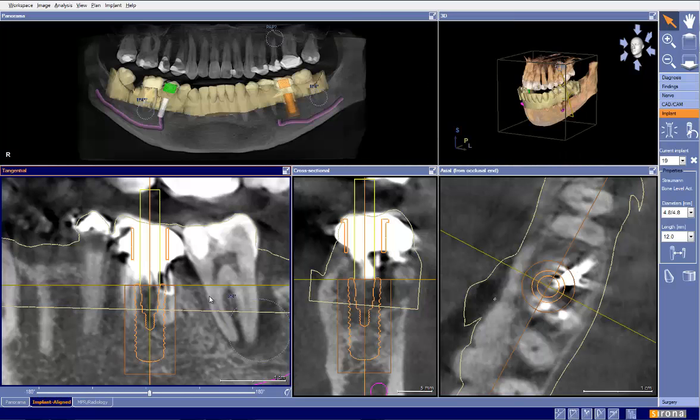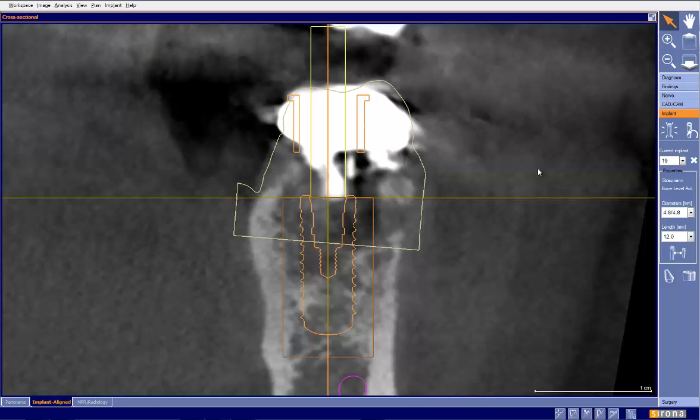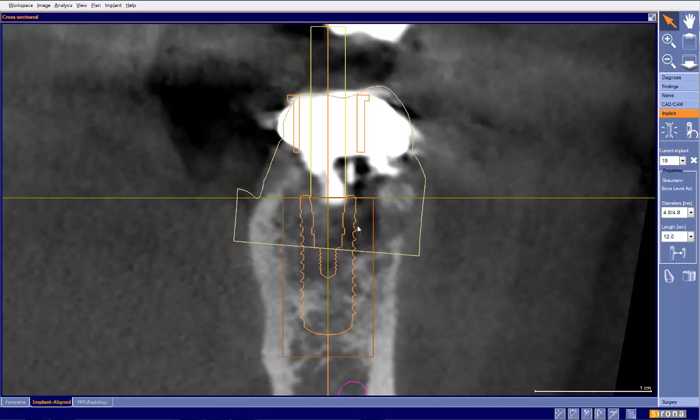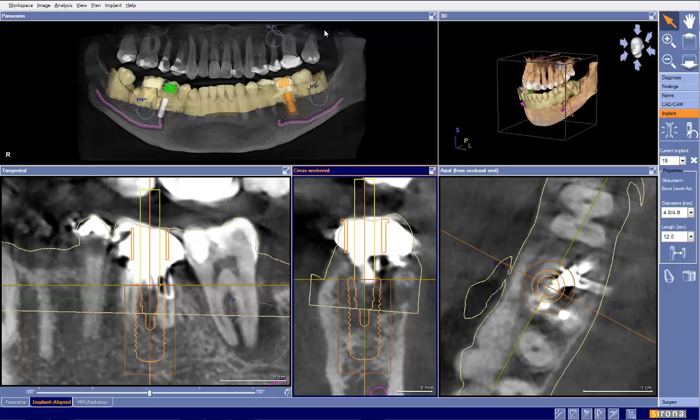Okay, so from a restorative and from an immediate placement perspective, I look at that. The other thing I look at here is if I draw our interproximal bone, buccolingual bone heights, we probably see that more like that. So if we drop 1 millimeter from there, we can probably see that this implant needs to go up just a hair, maybe even to about right there. And that's probably a more ideal position for this implant. Other than that, everything on the planning side is pretty well done.